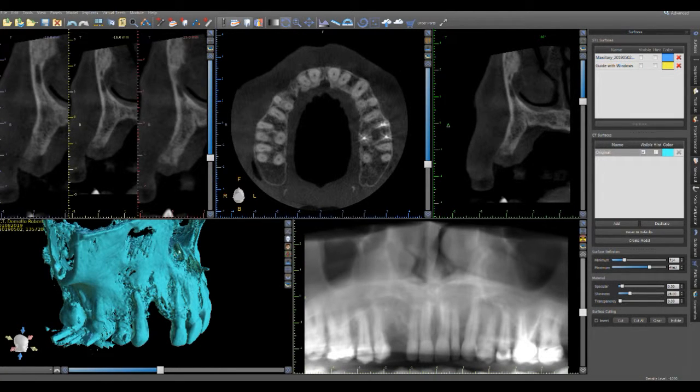I'd like to illustrate to you the true necessity of a 3D X-ray and the advantage we have at Alpine Dentistry with a computer-guided implant treatment. And this patient here needs an implant on the upper right. The image I'm looking at here shows a typical 2D panoramic image. It looks like this is a lot of space to place an implant, a lot of area up here for an implant to go. That's not quite true.